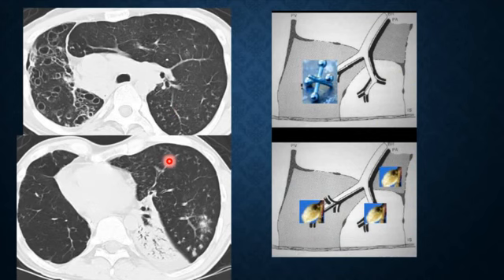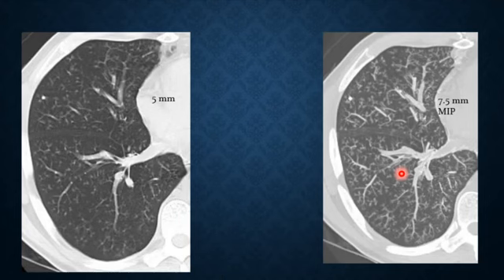Again, this is another case. You can see here these are bronchiectatic changes, don't worry about it. Just look here, you can see some centrilobular tiny nodules. Again, in the same patient at a different level, you can see these centrilobular nodules, this tree in bud appearance, here and there. Again, you can see here centrilobular faint tiny nodules.